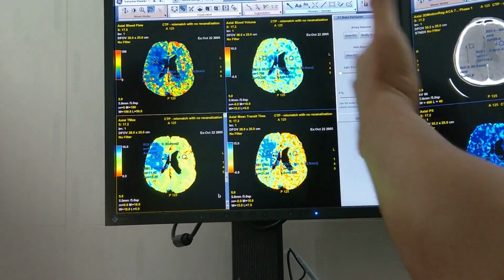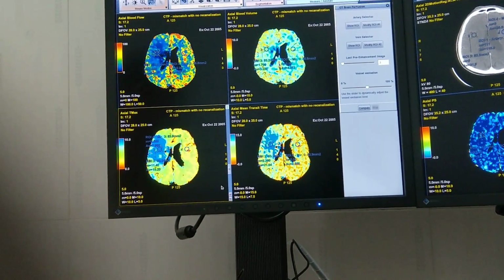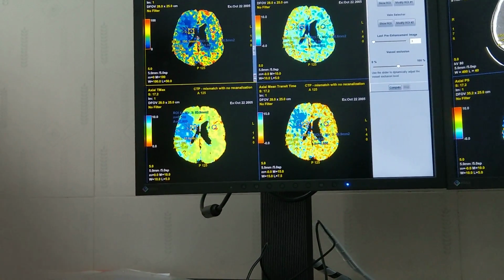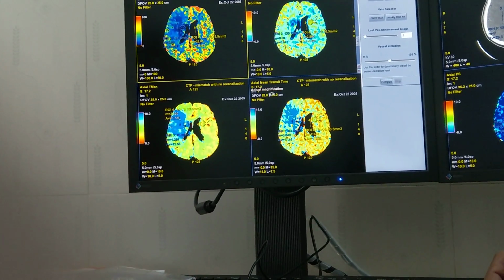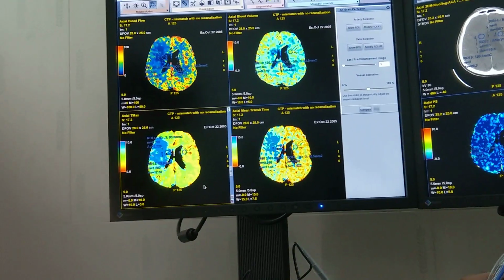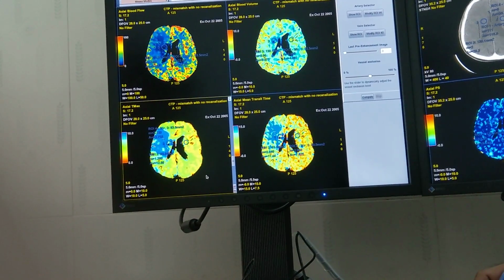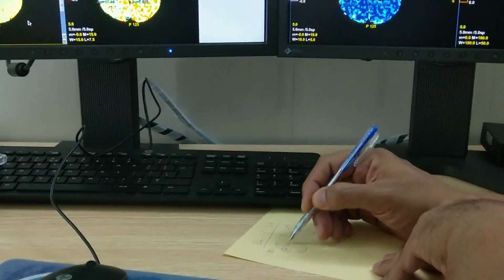If you want to compare relatively, okay, you can do a reference. Anything below, for example, this is right, this is left. Okay? There are papers saying that if over here this is normal, for example this cerebral volume, I already shared you the presentation yesterday, right? So let's say this is 20, this is 60, which is normal.